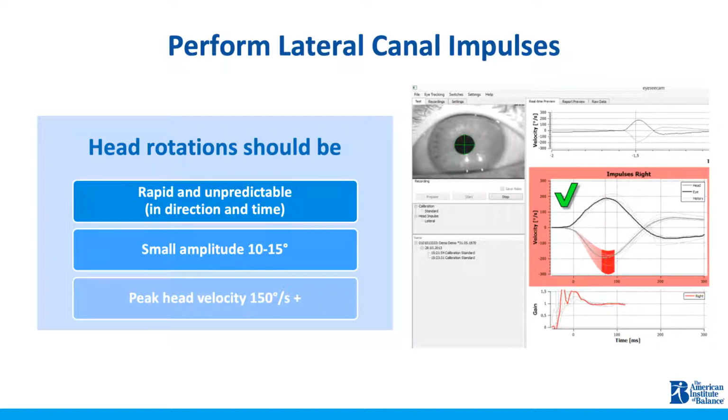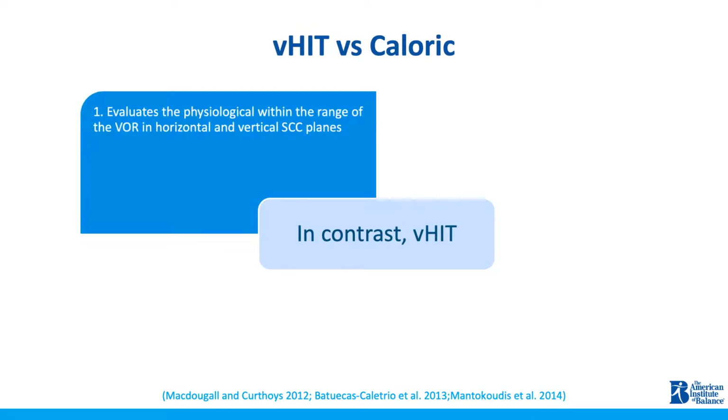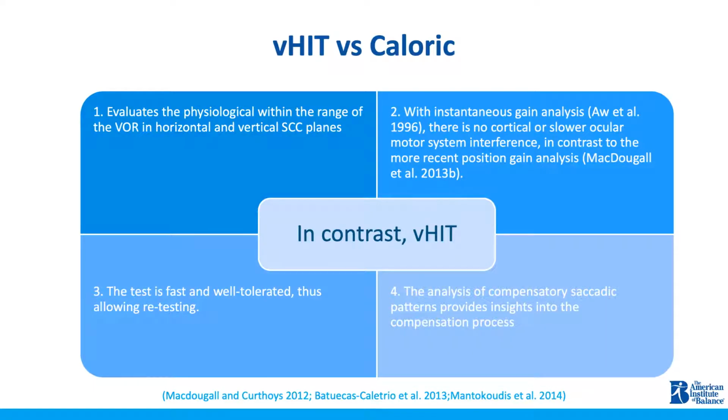Well, you know that the patient is compensated up to approximately 2 Hz, based on the fact that the high-frequency headshake, which was completed during your VNG testing, is the highest frequency test you've completed to this point, and it yielded normal findings. There was no post-headshake nystagmus. Let's talk about the one test that had abnormal findings, which was your caloric testing, indicating a left unilateral weakness. This result is typically a permanent finding and does not improve due to compensation because compensation occurs in the brain. This abnormal testing is likely showing the damage that occurred due to the suspected vestibulopathy.